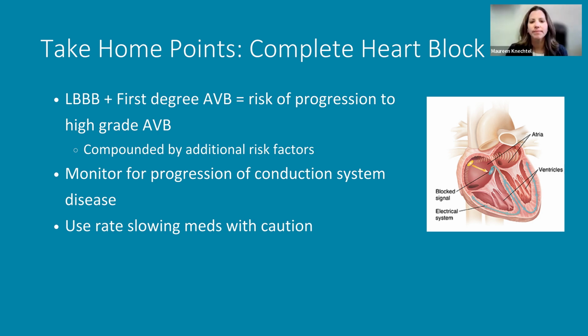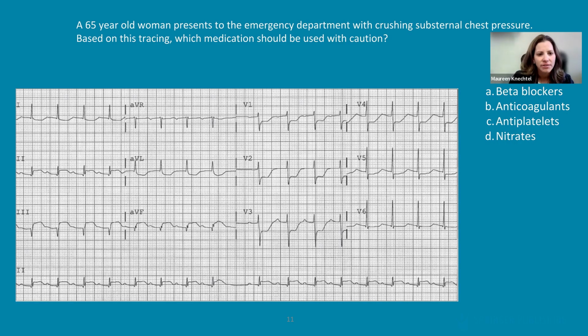Next case. A 65-year-old woman presents to the ED with crushing substernal chest pressure. Based on this tracing, what medication should be used with caution? So now we're going to make the question a little more difficult. First you have to be able to interpret this tracing, and then how might your interpretation affect your clinical intervention?